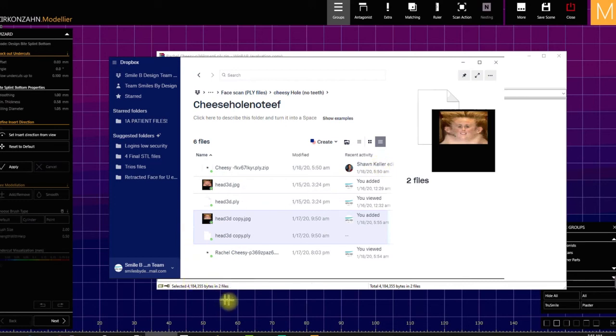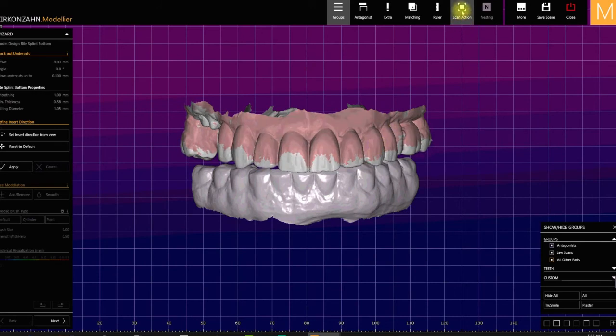So pause this and reverse it. I'm not going to do it all those times for you. All right, so now let's see how we did. So it should work perfectly. It's just because I have multiple scans might be how I did this.